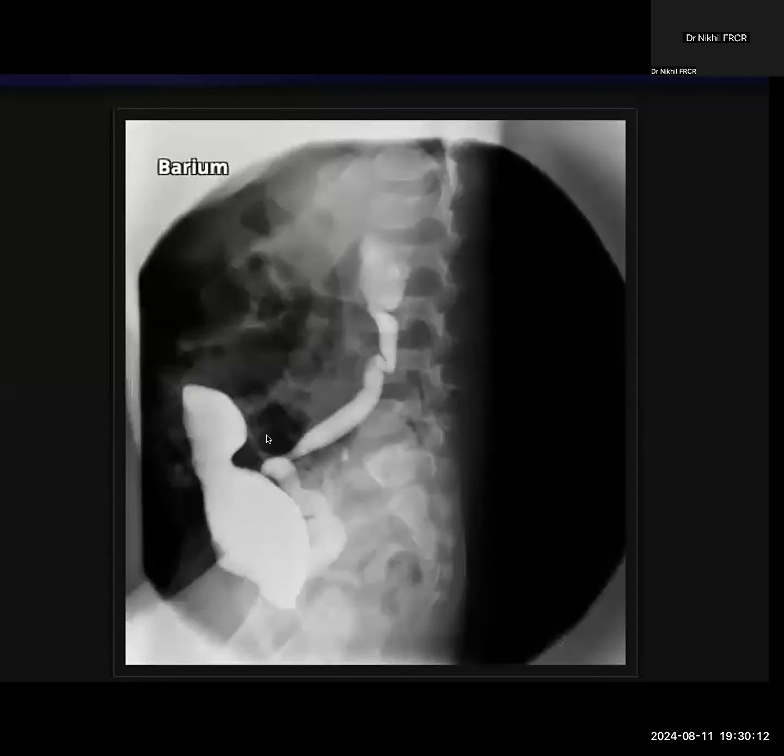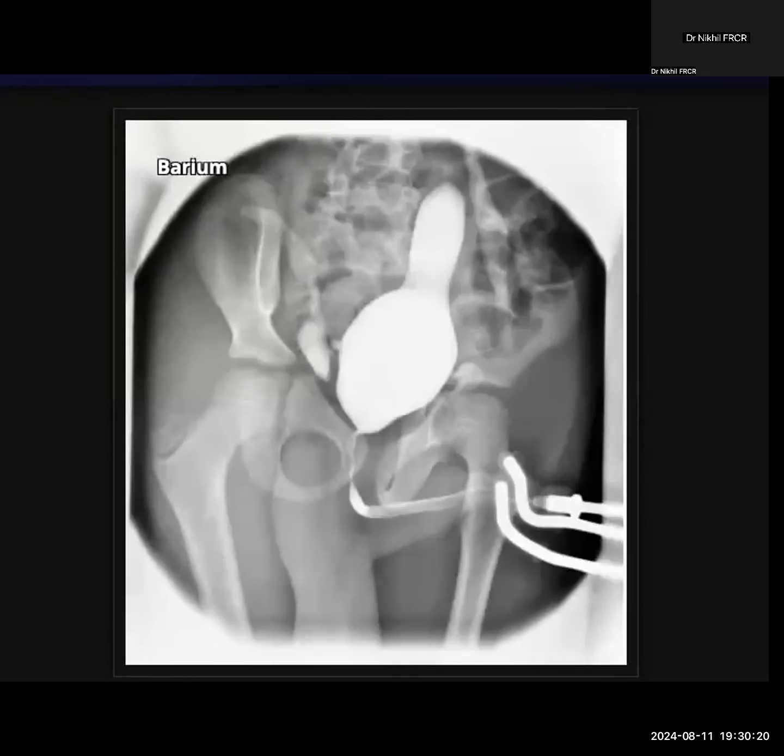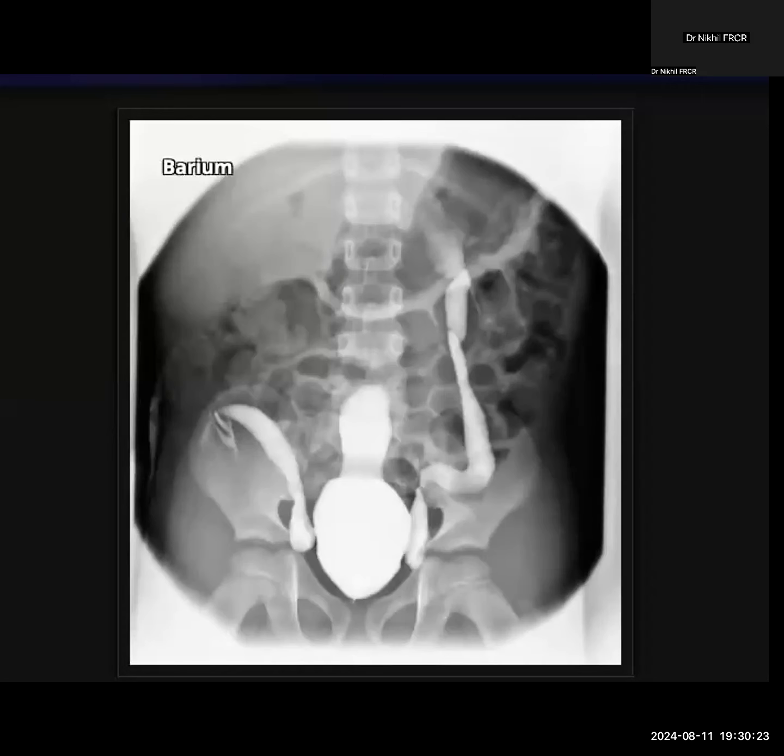So this was a case of vesico-urachal diverticulum. The fact that the diverticulum is extending anteriorly should make you think of it, and I'm glad that you did pick up that differential in the diagnosis. Apart from that, you saw vesico-ureteric reflux, and you were also spot on that you should be worried about a urachal adenocarcinoma in long-standing cases.